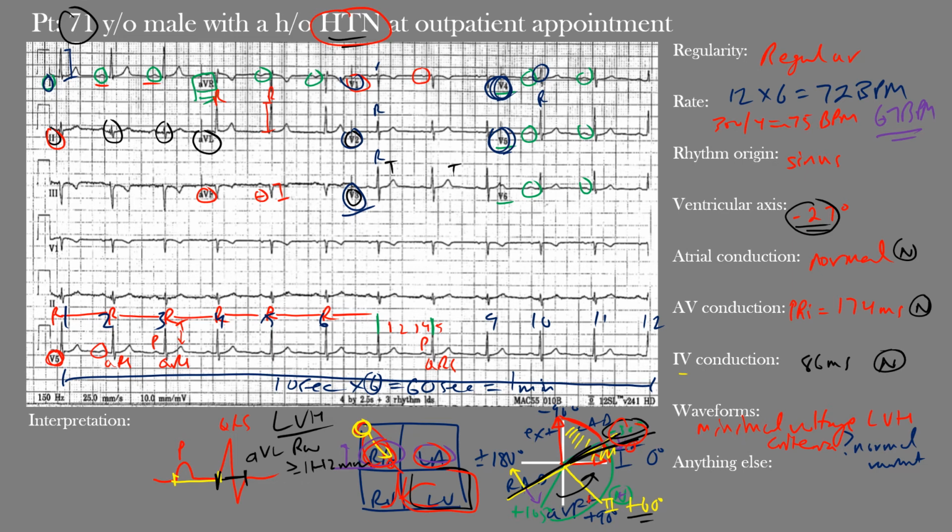Now, the transitional zone in the precordial leads also appears to occur between leads V2 and V3. This transitional zone is simply the precordial lead area where the QRS transitions from mostly negative to mostly positive, with the actual transitional area being where the QRS complex is isoelectric. Normally, the transition occurs between leads V3 and V4. If it occurs earlier than V3, we call this a counterclockwise rotation or early transition. If it occurs after lead V4, it's considered a clockwise rotation or late transition. Because we have it occurring here before V3, this is technically considered a counterclockwise rotation or early transition.